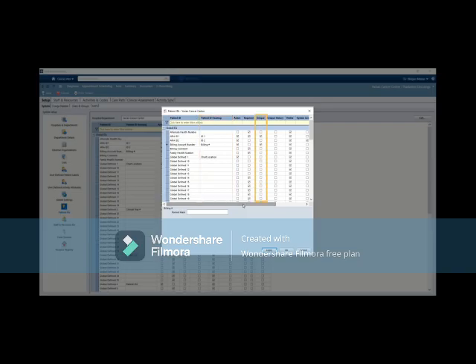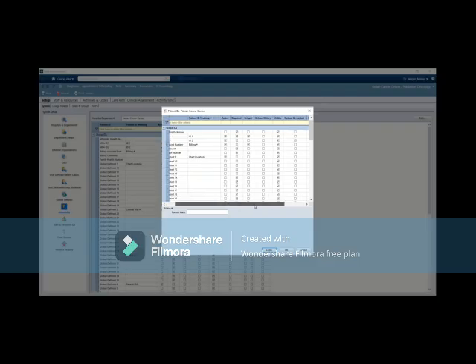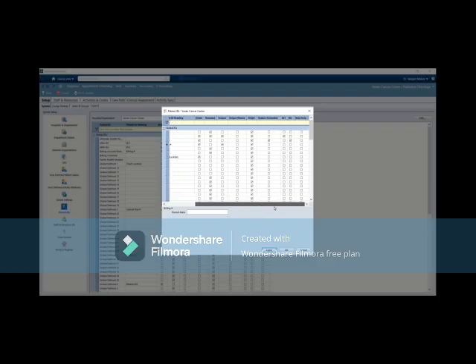In the Unique column, check to ensure the patient ID is unique to the database. Note, checking unique allows the patient ID to be reused if the patient's ID has been changed. Unique history allows a patient's ID to be reused only if the patient has been purged. Check System generated for automatic creation of ID numbers in sequential order. Read only will not allow editing of the ID even with appropriate user rights.